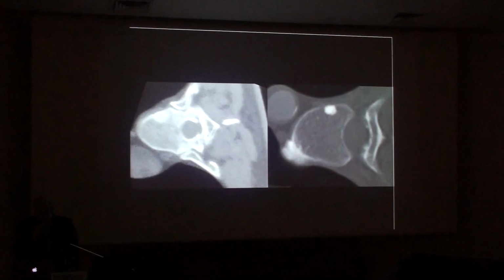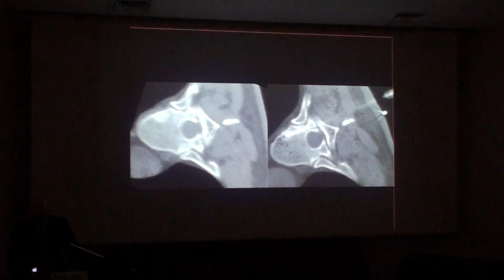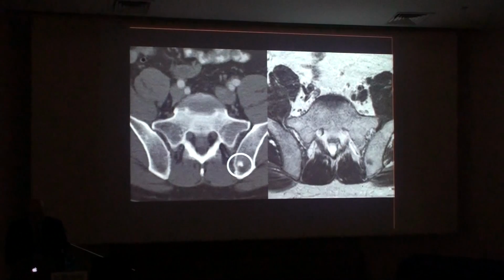This patient was recently diagnosed with prostate cancer with a single area of increased tracer accumulation on his bone scan, which was in fact a prostate metastasis proven by transpedicular biopsy. And how do you distinguish that from a bone island? Well, on imaging, it can be relatively easy sometimes. This is a patient recently diagnosed with prostate cancer, and this on CT during his initial exam was called a bone island. You could say, well, it's not the classic appearance, but it looked pretty good.